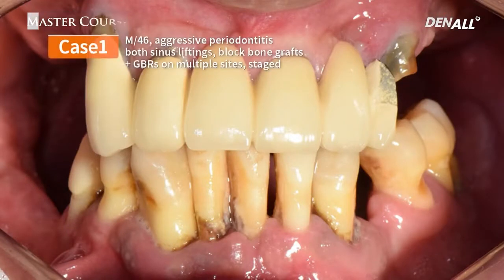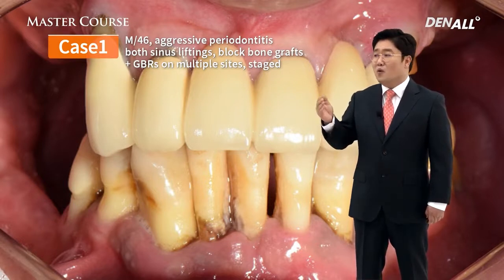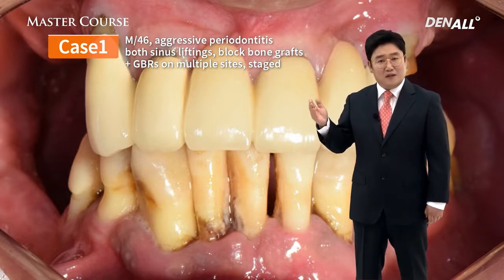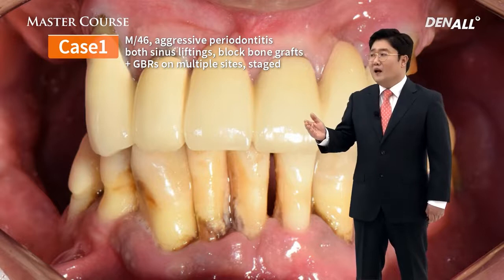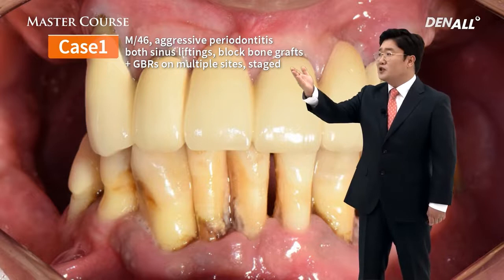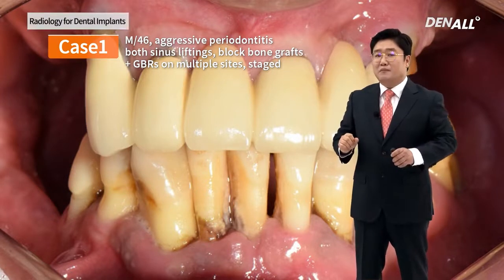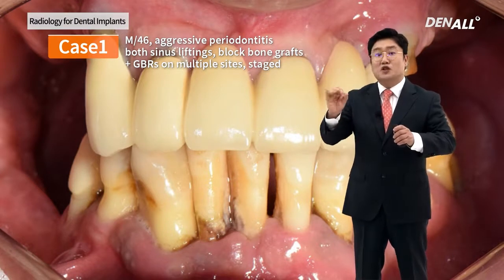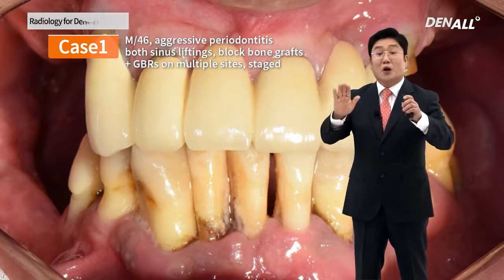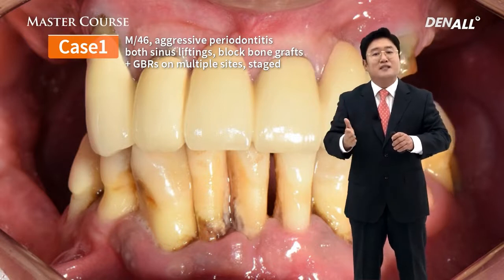If you look at this case, young male patient, he has an aggressive periodontitis. All teeth will be extracted and implants will be placed. However, the condition of teeth and the bone is very poor. As you can see, complicated procedures will be done at the same time. Immediate placement is the trend today. However, in this case, extraction will be done and the GBR will be done in stages for the implant treatment.